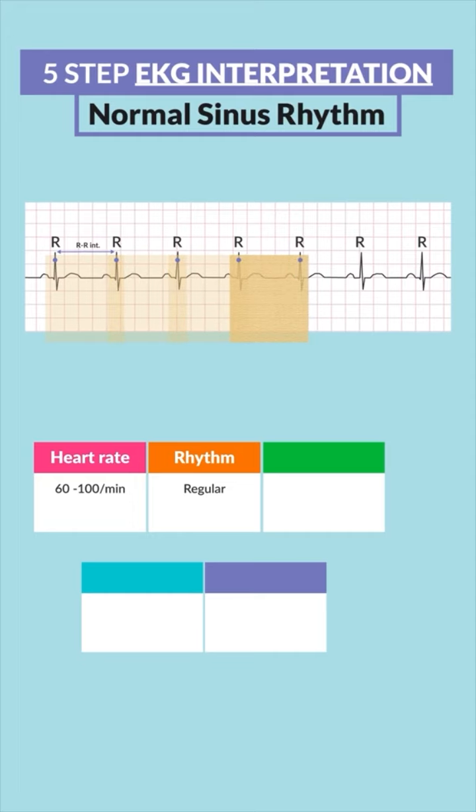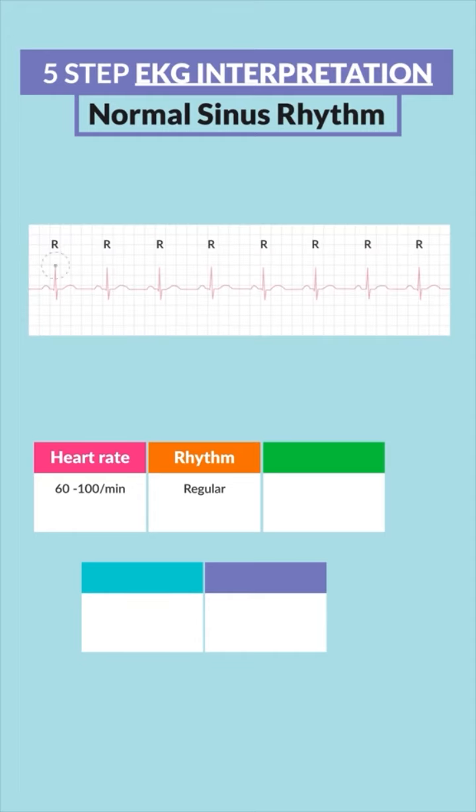This is called marching it out. So just march it out and watch me nay-nay. Okay. So the R peaks should be evenly spaced out every single time.